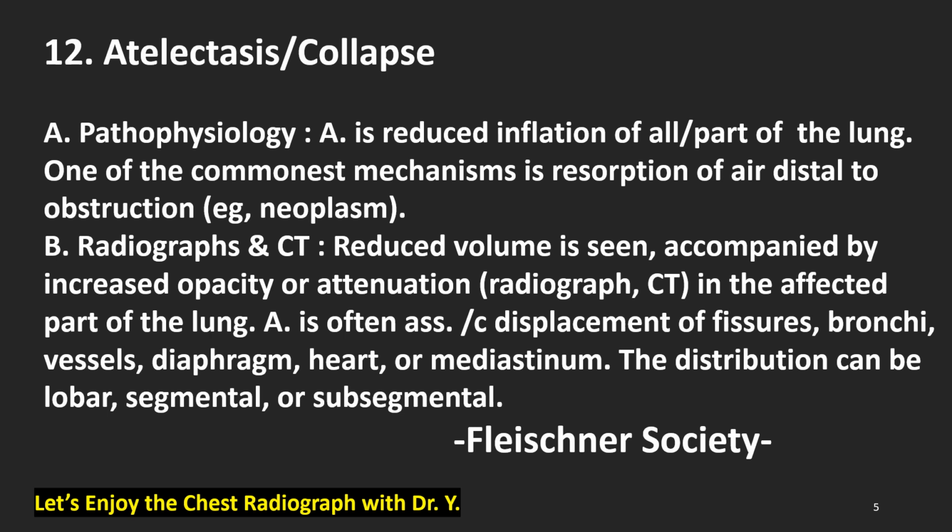Session 12, atelectasis, collapse. A. Pathophysiology. Atelectasis is reduced inflation of all or part of the lung. One of the commonest mechanisms is resorption of air distal to obstruction, e.g. neoplasm. B. Radiographs and CAT scan.